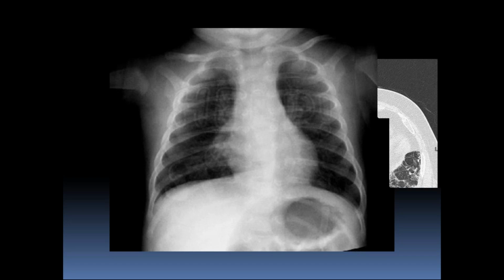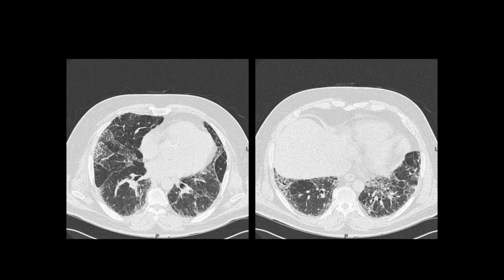So anyway, moving into another entity. This one is a little bit different. It's not as striking. You don't have big cystic spaces, but what you do have is a decent amount of ground glass. And you also have some pretty decent sized airways. Now, it can be subtle, but if you compare it to the adjacent arteries, you can see that they are a little bit big, and over here, being as close to the pleura as you are, the airway shouldn't be that big, so you do have some mild bronchiectasis.